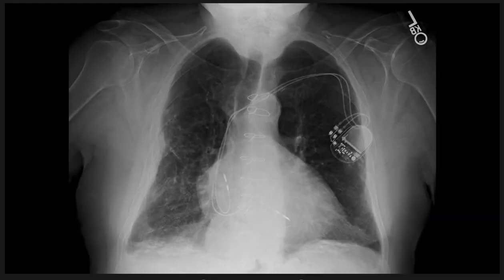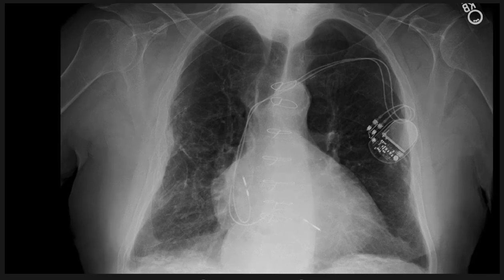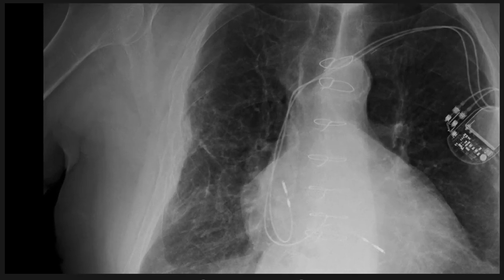Another case. Zoom up here. So this is a little different, right? Instead of being apical or being at the costophrenic angle there, this one's more lateral. Now, just like the pleural effusion, I like to explain things. Am I missing something here?